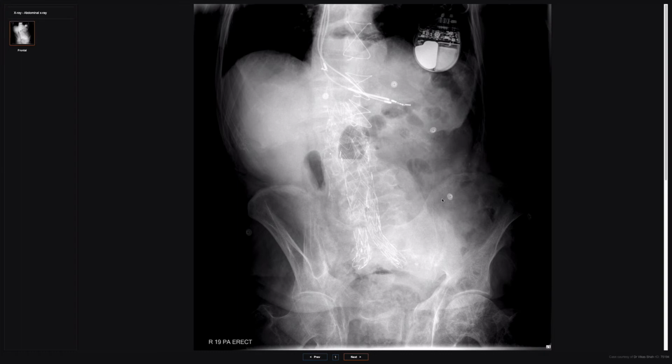Now, another thing on here, just going back to D. D was about calcifications. Okay, so we looked at kidney stones and ureteric stones, calcified peritoneum and aneurysm. D is also for bones as well. Now, there's a lot of bones on an abdominal radiograph to analyze. You've got the whole of the lumbar spine and the iliac bones, and then all the usual bony diseases that you see elsewhere, you'll pick up here.